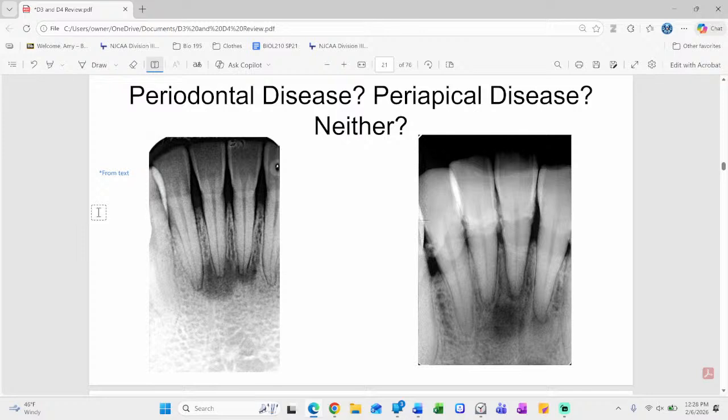But again, no caries, no restorations. We do have some bone loss here for sure. But I've got this big lucency surrounding probably 3 apices there. Anybody want to take a guess? Come on, somebody. So traumatic bone cyst is totally radiolucent, right? A cyst totally radiolucent. Not in this case.